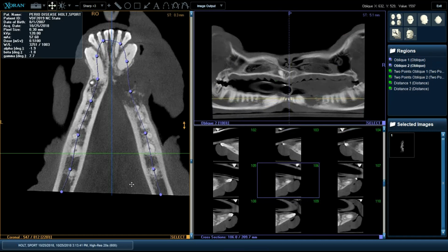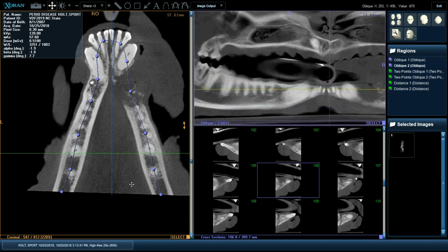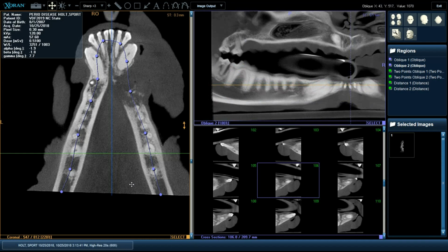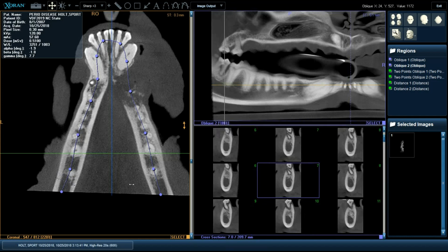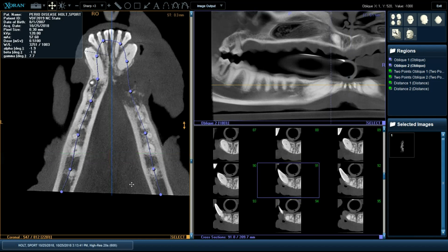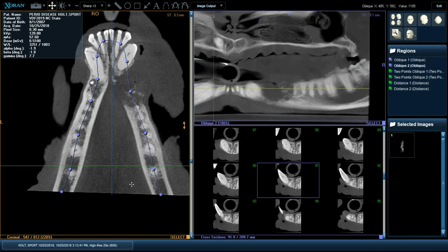And we could now see this mandibular panoramic view, which interestingly, something I hadn't seen before. Just a moment ago, I didn't go far back here, but this panoramic view makes this lesion jump at me immediately. We're on the left side, and I can see here that there's significant bone loss around this root, something that I didn't see just earlier as I didn't travel all the way back. But now this is going to be very, very obvious. And of course, we have this large defect.